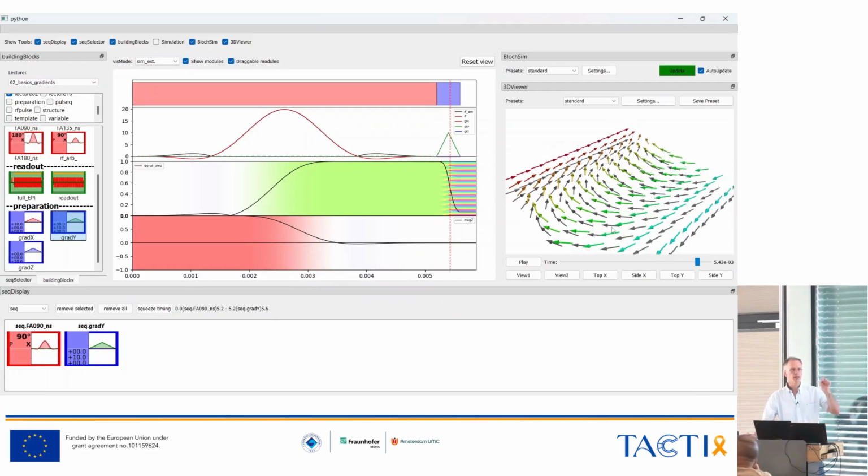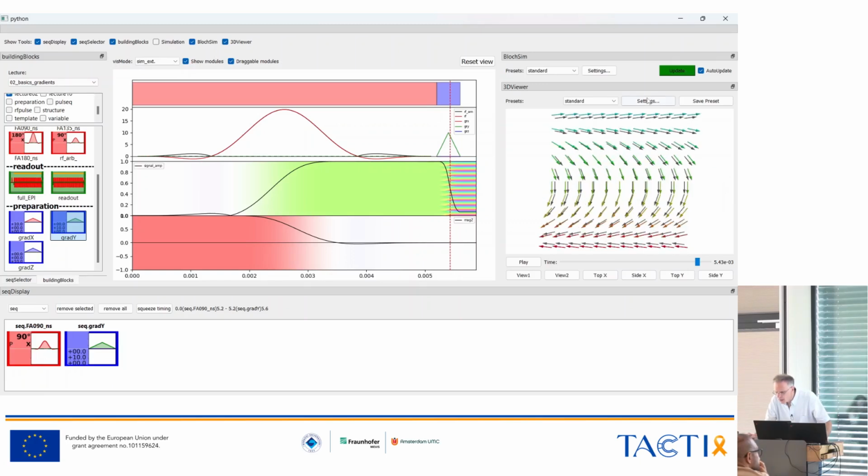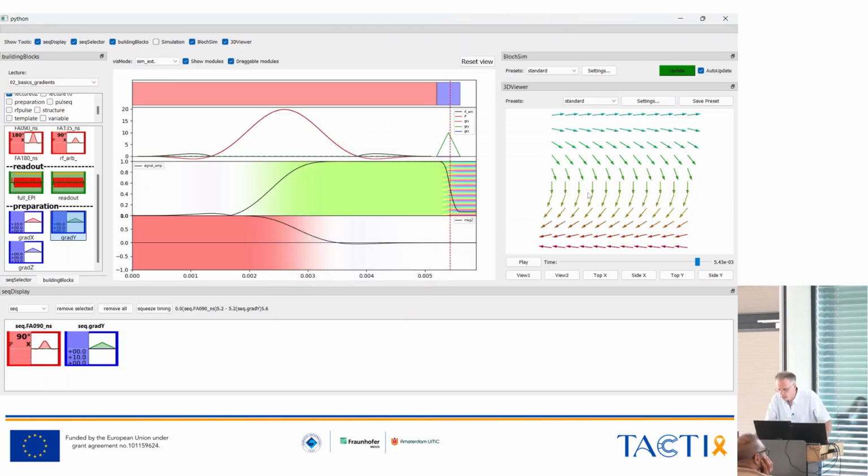And what is happening? Let's look at our magnetization from the top, and I'm switching off the shadows to only get the pure magnetization. So we have the isocenter located here, exactly in the center of our magnetization. If you remember, the gradient was going from a minus value to a plus value, and in the isocenter it was 0, so there's no additional field. There the magnetization will just stay exactly the same.